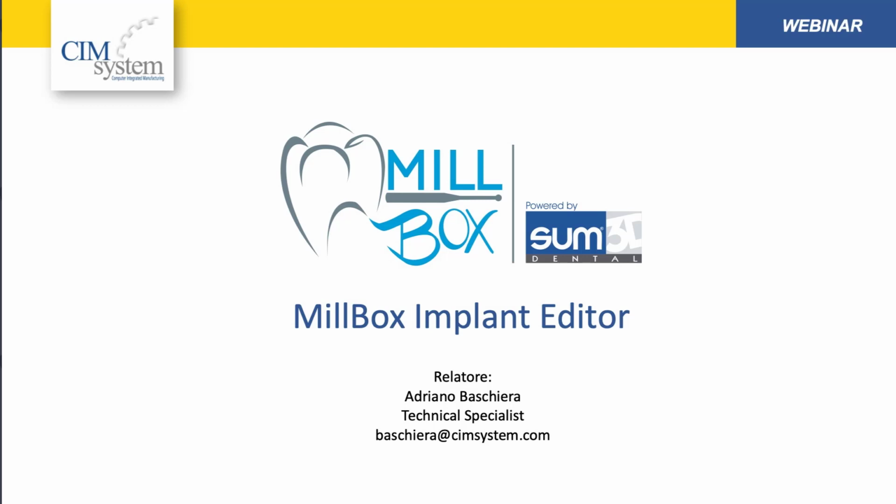Today we are going to have a webinar on MillBox Implant Editor and its integration with MillBox. First of all, in MillBox, it's possible to mill directly from an STL file or using a replace system feature that is inside MillBox.